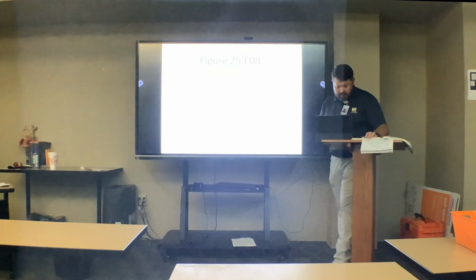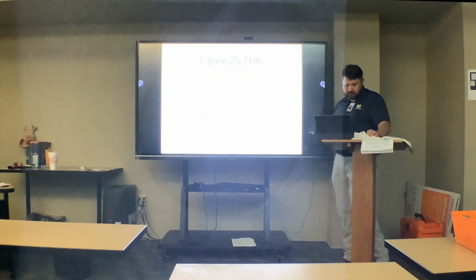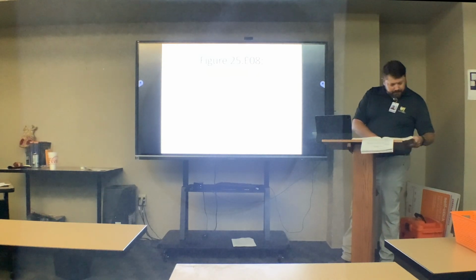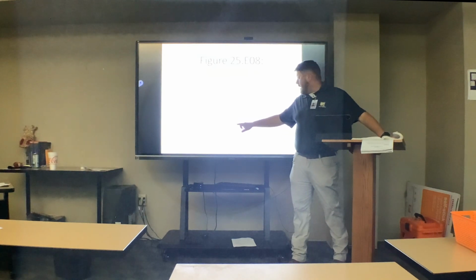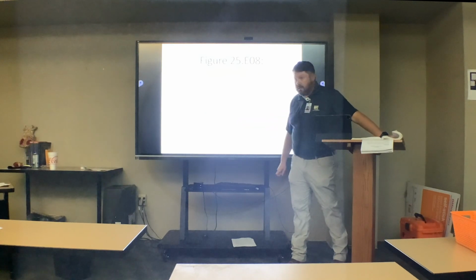This one too, but let's see what they say. This is not the P wave. That's the T wave. That is a small S wave that could be considered a pseudo S wave there. It goes into the T wave.